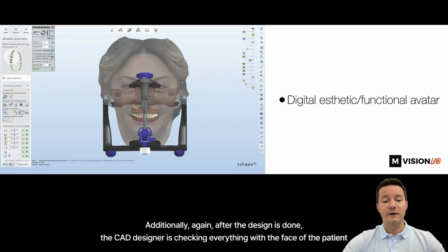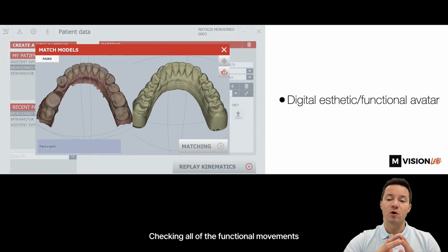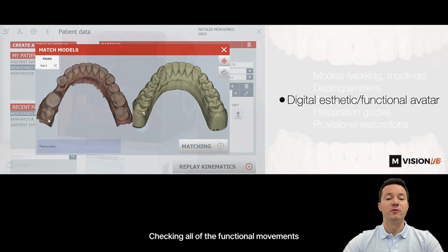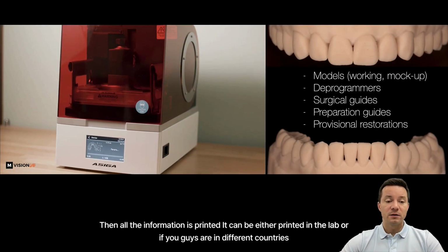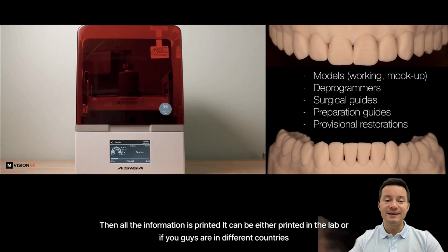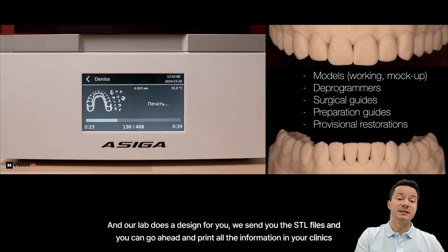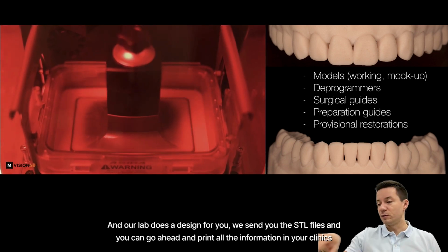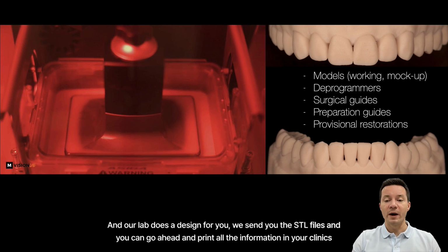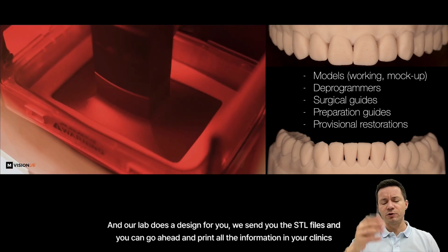Additionally, again, after the design is done, the CAD designer is checking everything with the face of the patient and checking all of the functional movements. Then all the information is printed. It can be either printed in the lab, or if you guys are in a different country and our lab does a design for you, we send you the STL files and you can go ahead and print all the information in your lab. So you in your clinic, sorry.